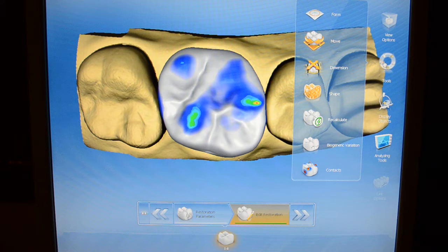So we're going to go through these one at a time, but what I would like you to remember, whenever you're using tools, is to use the tools that make the biggest movements first, that move the largest pieces of tooth first, and work your way down to fine movements. People could get lost in tool town pretty easily if you start messing around with fine things like putting in tertiary anatomy and forgetting that you need to move a cusp or a marginal ridge, because then you go to move one of those big pieces of tooth and all of a sudden your beautiful anatomy has changed again.